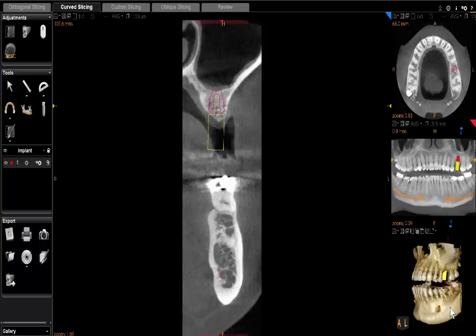When you do a screenshot in CS3D Imaging, it also adds your screenshot to another place, the Image Gallery. This is so that your screenshots may also be used in more advanced reporting methods, but you may work with your screenshots directly from the gallery as well.